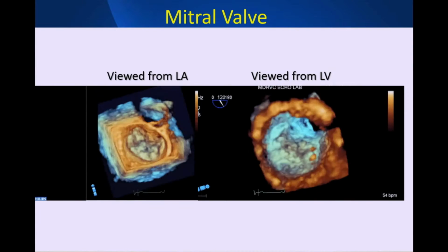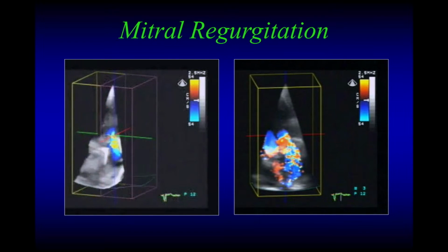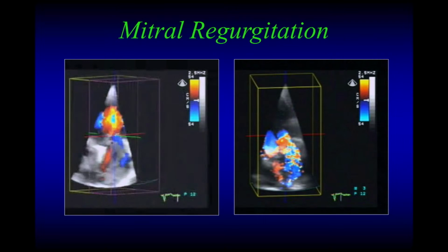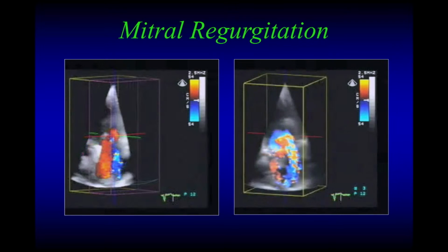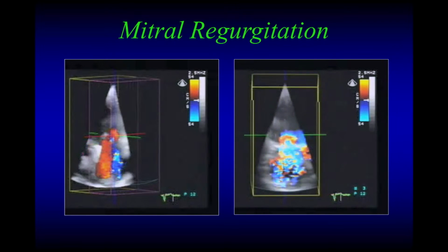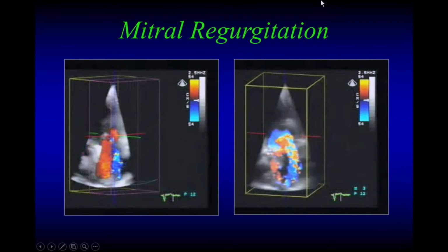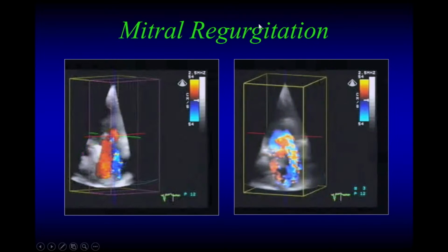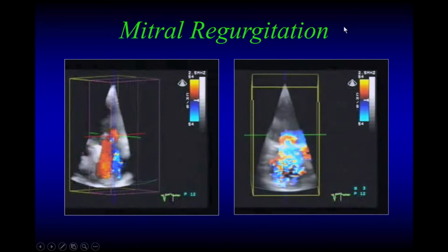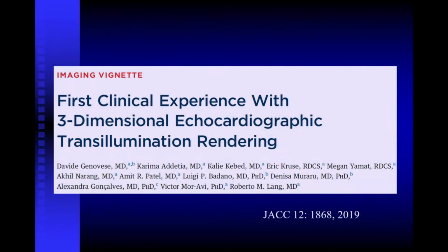So I know, particularly for mitral valve pathology, 3D ultrasound is really very important to tell us, particularly from the transesophageal approach. This is 3D color Doppler. Yes, it is impressive that you could take a look at the whole jet itself, but some of the quantitative parameters are those for vena contracta and some of the PISA calculations for color Doppler, meaning the flow convergence coming into the mitral regurgitation, much less of the volume of the jet itself.